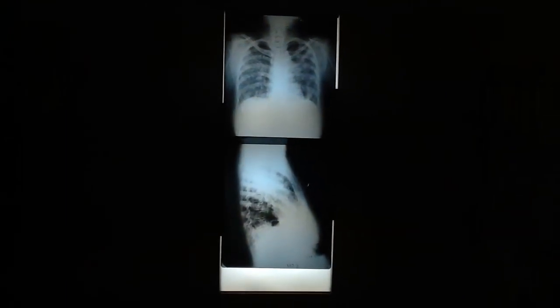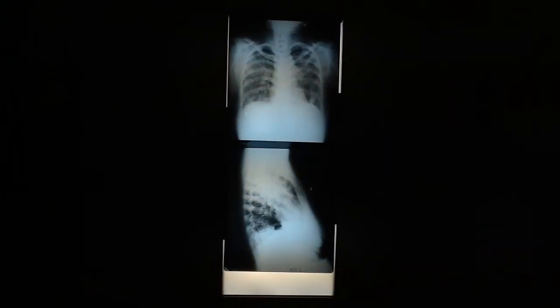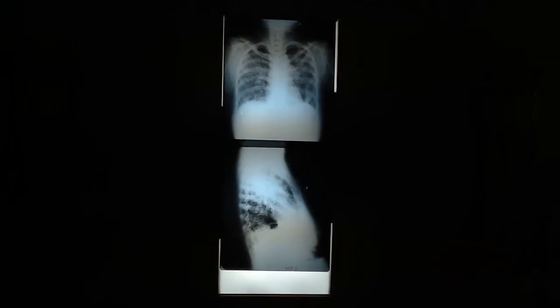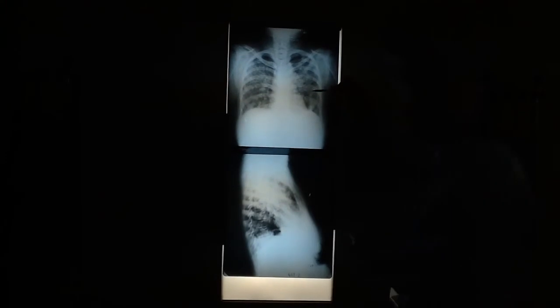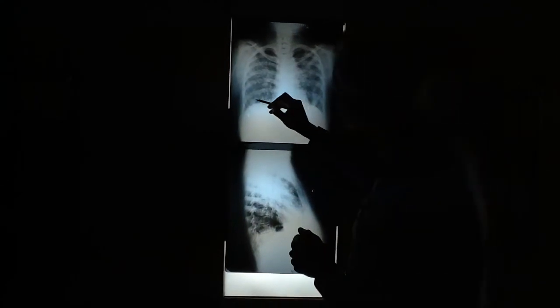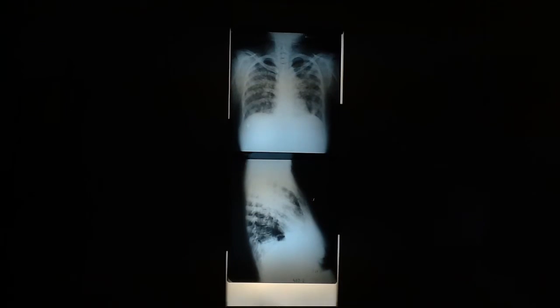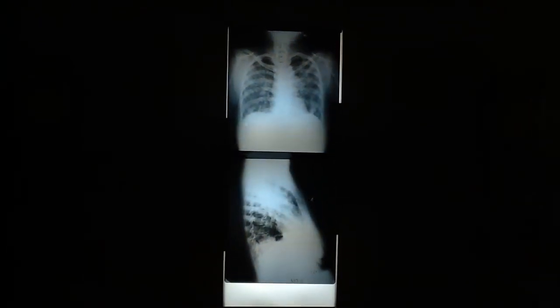Interstitial disease. Does this look like dots or does it look like reticulation? Dots. It may actually be both. But there's also, if you look, a little bit of fuzzy density kind of right through here, maybe a little over here, a little down in here. There may be some little patchy airspace consolidated areas in here also.